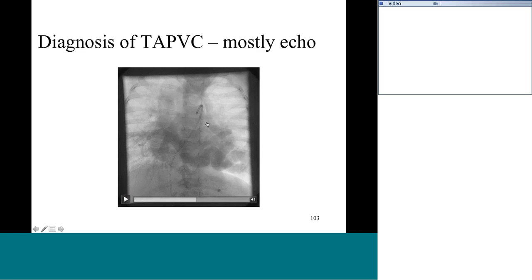Now, if you go by echocardiography, if you find that there is a left vertical vein, but you are not demonstrating a proper common chamber, don't send them for surgery. You put them for some other detailed imaging. Because if the surgeon opens here, he won't find a common chamber, and then he'll be stuck there. The patient will not be able to come off by that.